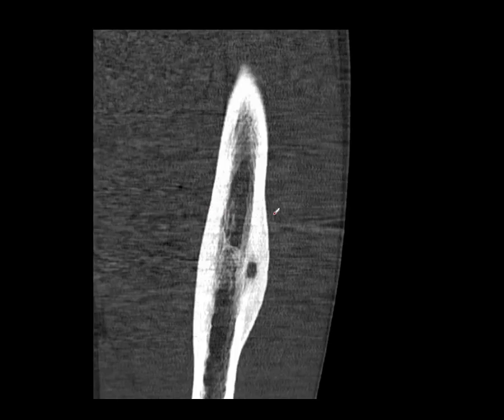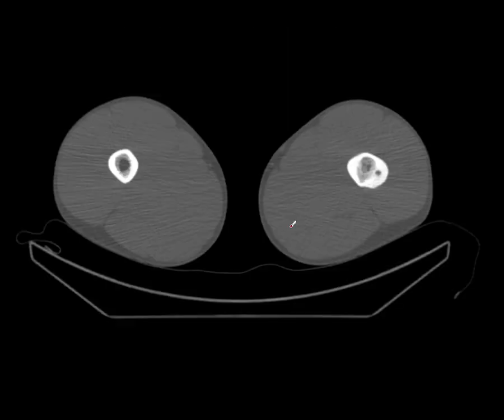So we do have a CT image here, and this is showing just the same thing in greater detail. You can see the central nidus and the exuberant periosteal reaction around it. Here we can see it on our SPECT CT view, nidus, intense periosteal reaction, but of a mature type.